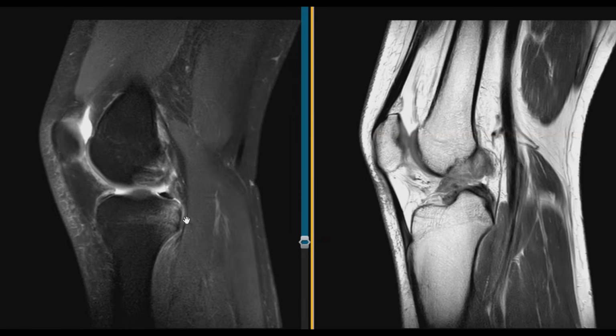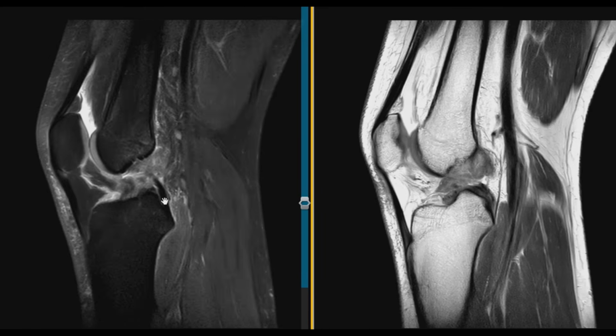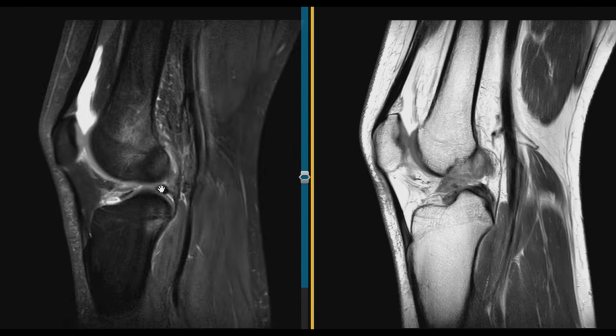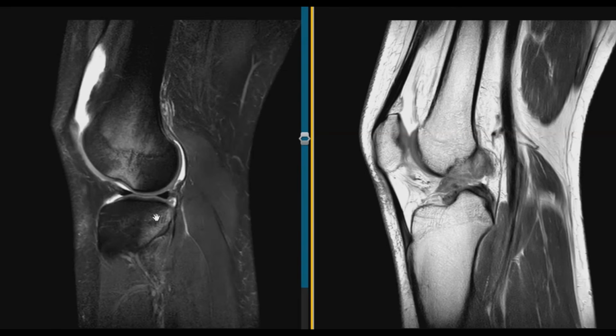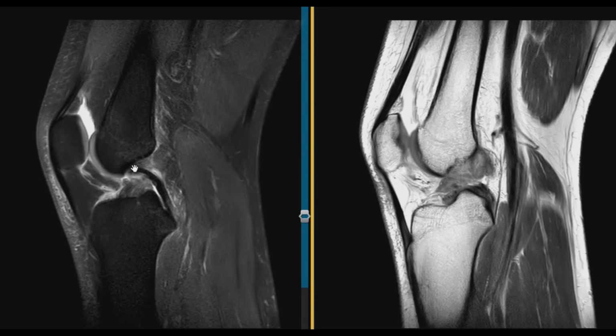And if we go to the opposite side of the knee, this is the medial side, we see another bone bruise back here. Bone contusions or bruises look bright, so this bone here also moved forward and impacted and came back, but there's no corresponding bruise over here. So this is a torn or ruptured anterior cruciate ligament. We see the ACL completely torn. We see evidence that this bone shifted really far forward, impacted, and came back to position, rupturing that ACL. We also see that the PCL is intact.